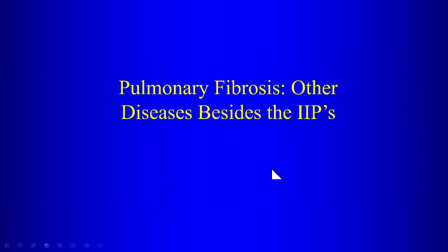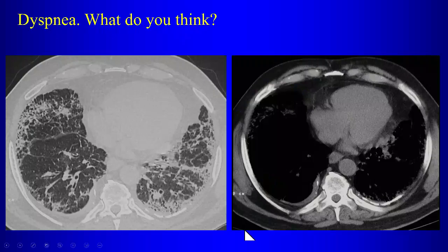Now, are we done? Of course we're not done. We're talking about pulmonary fibrosis. There are other diseases, of course, that can give you pulmonary fibrosis besides the idiopathic interstitial pneumonias. So looking at the imaging here, tell me what the findings are, and then tell me what you're thinking about.